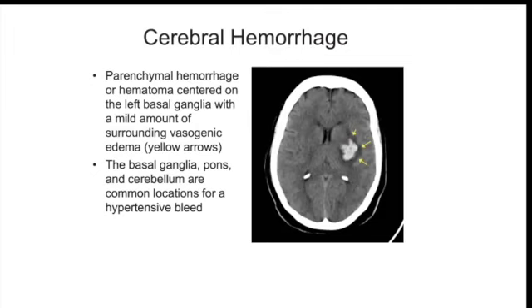And it's also in the cases of vasogenic edema. If you're looking at a vasogenic edema, you would note that the gray to white matter differentiation should be maintained. It means that if you're looking at the central part, the darker part, which should be the white matter, like in here, for example, you should be able to notice that there are darker parts on the inside and also brighter parts on the outside. Even at the site of the hemorrhage, you should be able to notice that it's still brighter here and a little bit darker on the outside. Okay. So it's maintained, as I said, in these cases of edema.